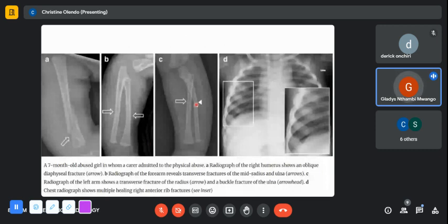Now, in terms of specificity, what would increase your confidence that this is not an accidental injury, would it be anterior or posterior rib fracture? Posterior rib fractures, yeah. That is true, and also fractures of different ages. Then the other thing would be a diaphyseal fracture in a child who is not walking. Again, that would be a high index of suspicion, and the corner fractures. I think we talked about the others, the scapula, especially the acromion, and the lateral clavicle.